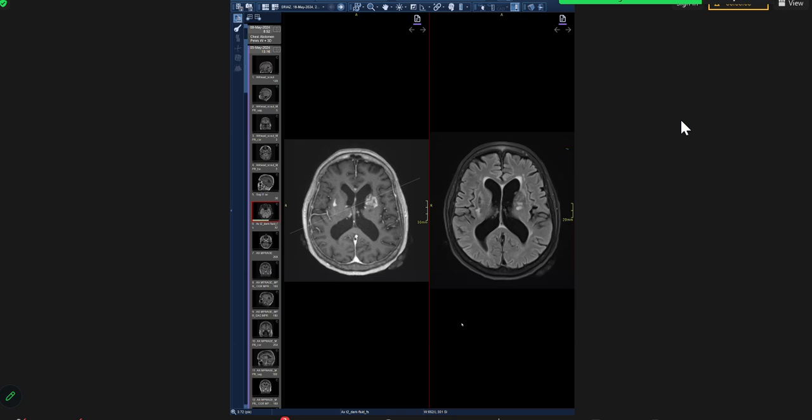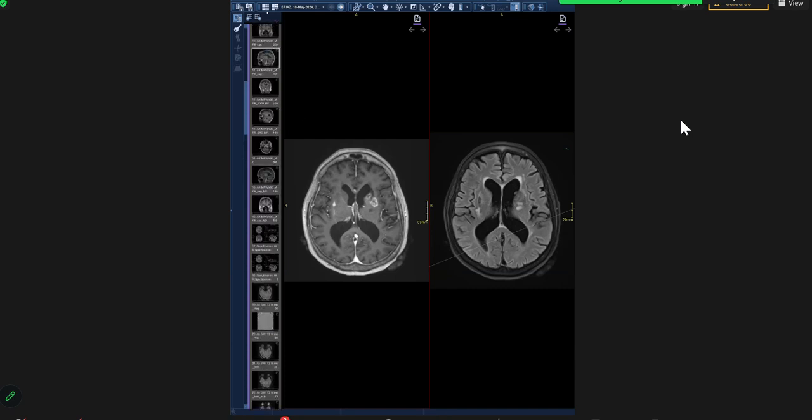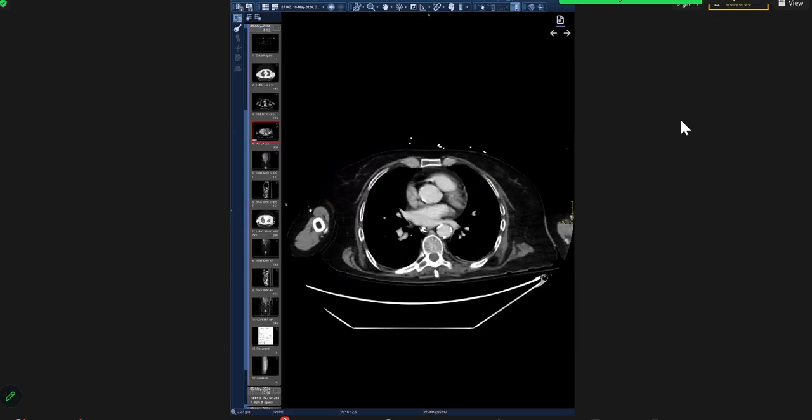So next, I would like to review the clinical notes for any previous history or previous imaging, if available, and look for the immunocompromised status of the patient. Okay. So I'm going to show you another thing, and I want you to tell me the diagnosis. Start from here.